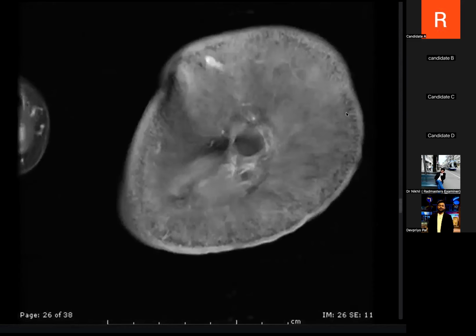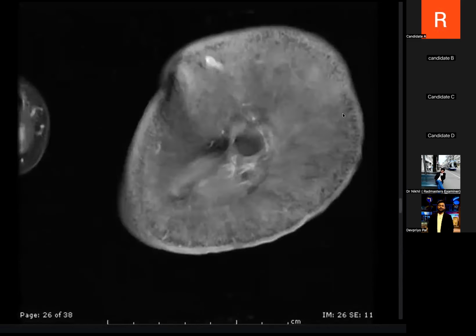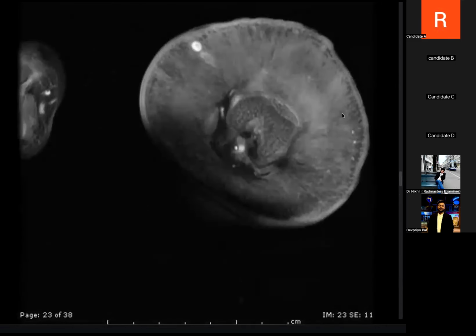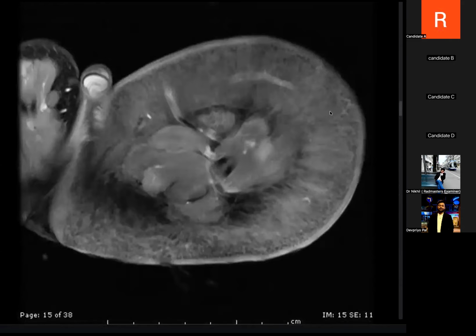So the vessels show contrast enhancement, but I cannot appreciate any other significant vascular structures within the enlarged subcutaneous tissue swelling. So this, as I think of it, is a vascular malformation, probably a venous malformation. I will review this. I will convey the findings to the referring physician and arrange for the pediatric vascular team for further management and MDM discussion. Okay.